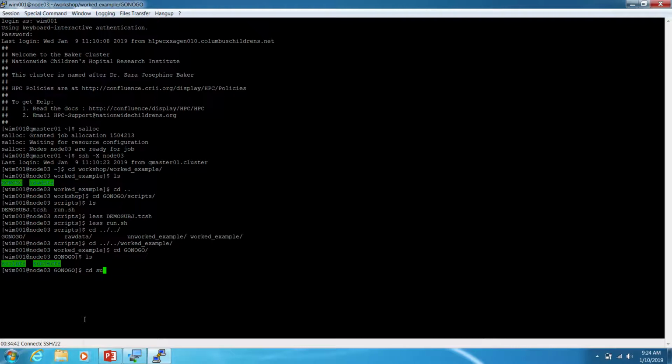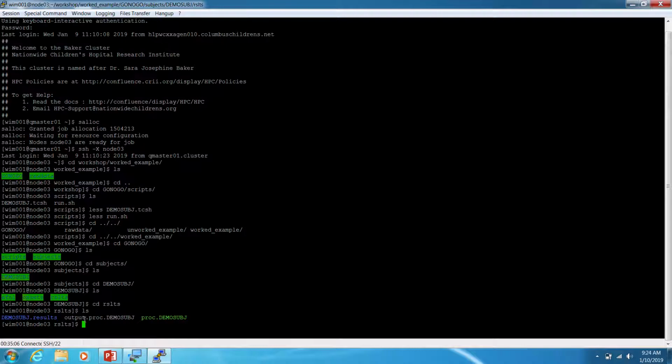If we take a look, our subject data from that script ends up being stored here in this demo subject directory. And if we look here, there's also a results folder. I'm showing you more than I would ordinarily, just so you can see the structure.